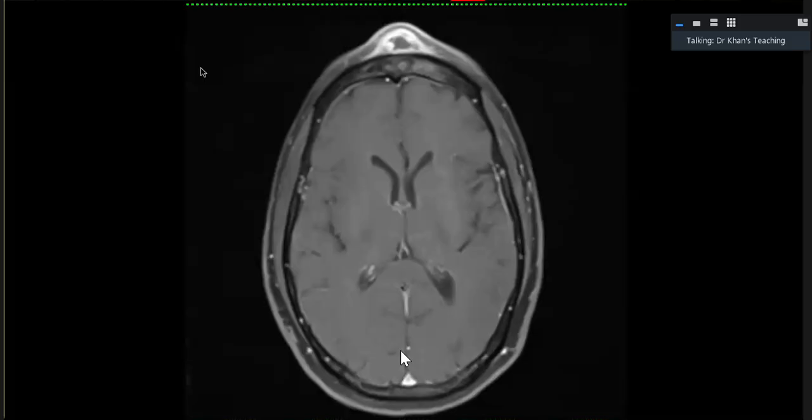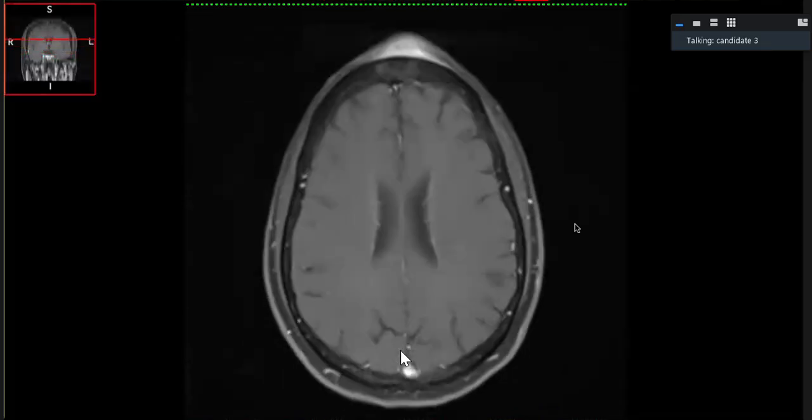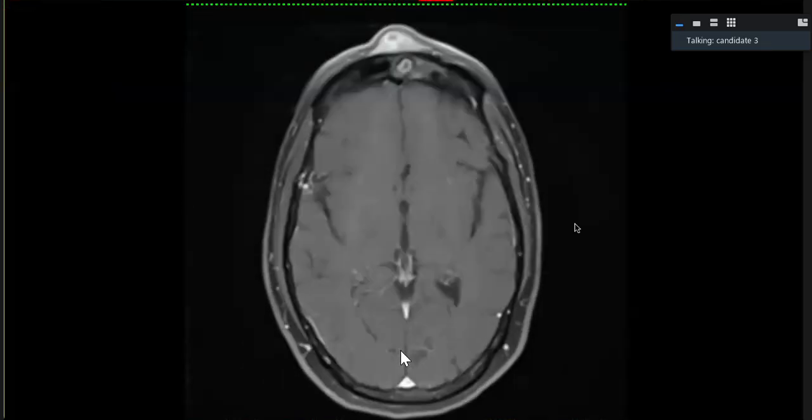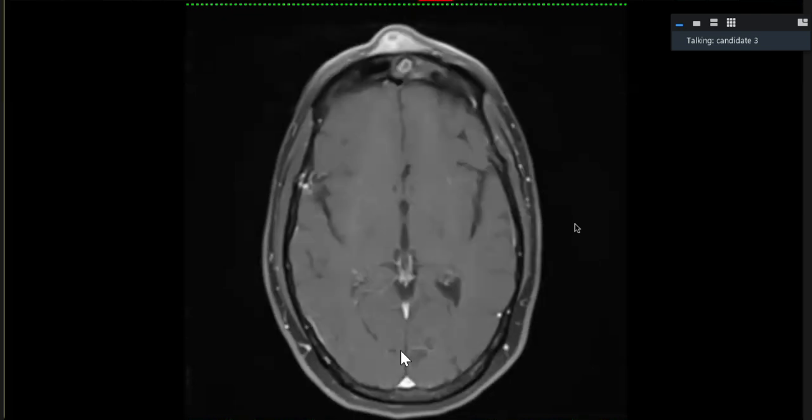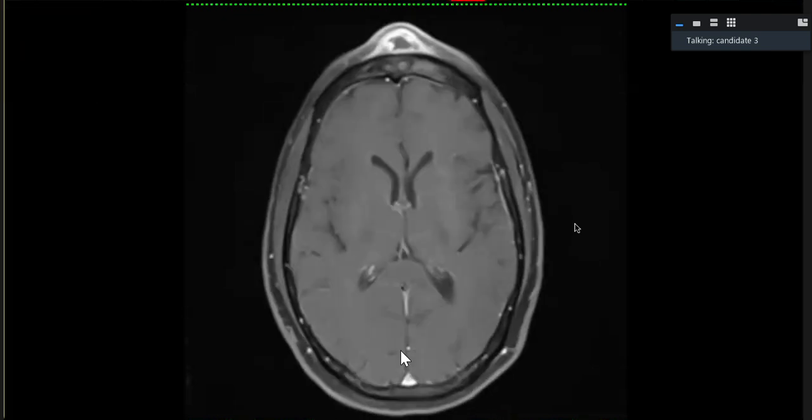Okay, this is T1 fat sat post contrast, in which the lesion shows central necrosis and a peripheral thick rim of enhancement, and the necrotic fluid component was showing diffusion restriction. So, likely an infective process, osteomyelitis of the frontal bone with overlying abscess formation in a subperiosteal location. I will refer the patient to ENT and neurosurgery MDT for further management, which can be antibiotics, and pus aspiration and analysis can be done for accurate management.